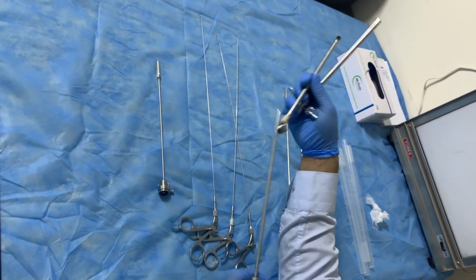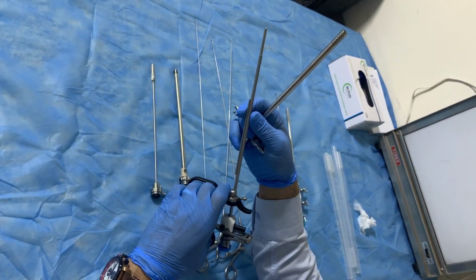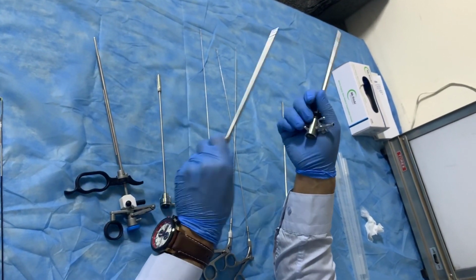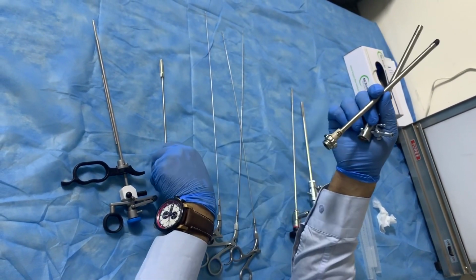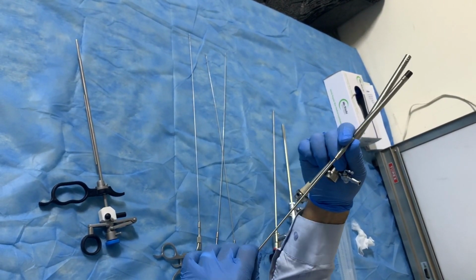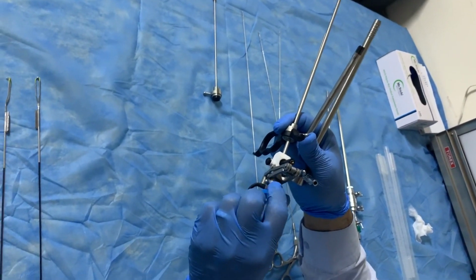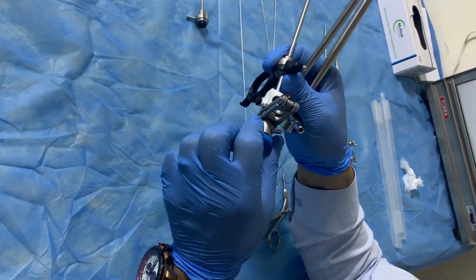This working part has two types, passive or active. This is the inner sheath and this is the outer sheath. This is the dilator. It is not important. When we want to push in immediately, we need to use the dilator. And also here there is a guide. Also there is a line, one parallel to each other, to be fixed. Otherwise it will release.